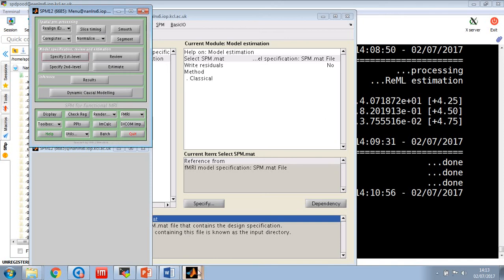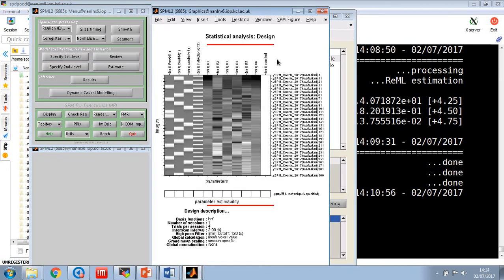But before we do that, I want to quickly show you how you check what your design looks like and how it works. So in SPM, this is the design matrix. The first thing here is our 4 conditions: free movement, listed here by basis set 1, the canonical HRF, cued motion, the control condition, and the instruction. Hopefully you remember when we built the model, this is just like the normal data where the responses change over time, but we're looking from above.